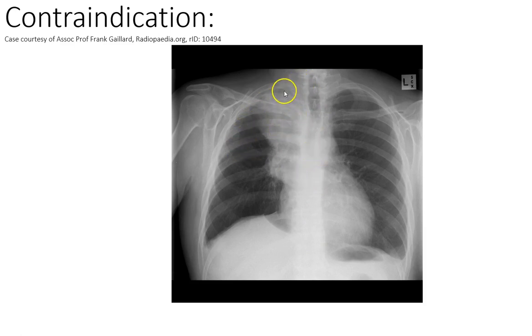So looking down here, I can see there's something going on here. And there's something here. Okay, the rest of this doesn't look too bad, and this looks too bad. And what's going on here is you've got lung cancer, so the air can no longer get into the upper lobe. It's occluding the upper lobe bronchus, and so the air isn't really getting into that upper lobe. So you've got consolidation collapse of the right upper lobe, but you've got a lung cancer there that's causing it.